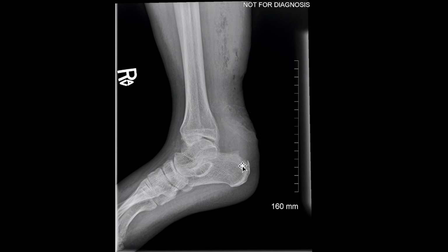First thought that should come to your mind is osteomyelitis. This happened to be a type 1 diabetic, poorly controlled, and he had osseous destruction, definitely pathognomonic and concerning for osteomyelitis. Now, what do you make of these lucencies here in the soft tissue? Lucencies on radiographs should be suggestive of air. Why would there be air in the soft tissue? So this is highly concerning for necrotizing fasciitis.